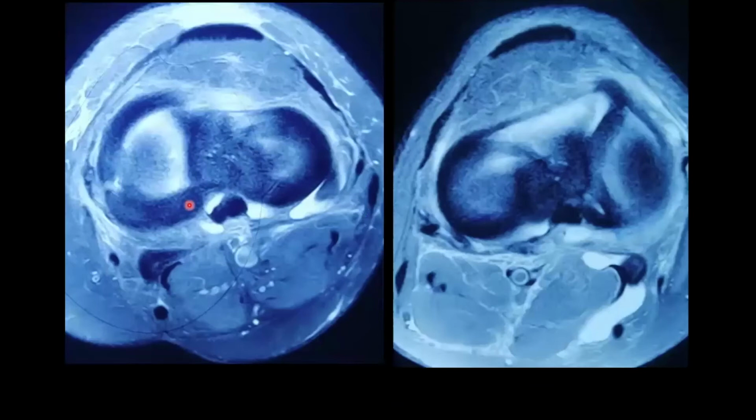While discussing the meniscus, all cuts are very, very important. The sagittal cut, the coronal cut, and we should not miss to see the thin cuts of the axial section, because these axial sections may show the complete radial tear as shown in the first picture, and bucket handle tear as in the second picture. These axial cuts are also very important to know the location of the tear.